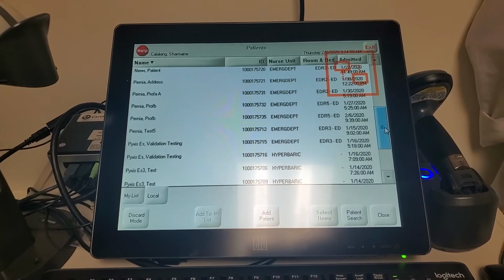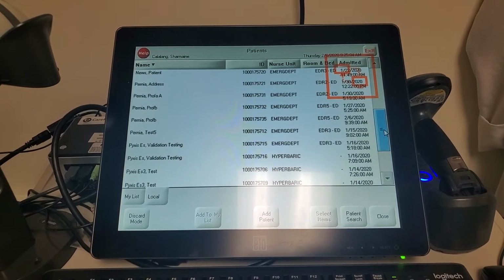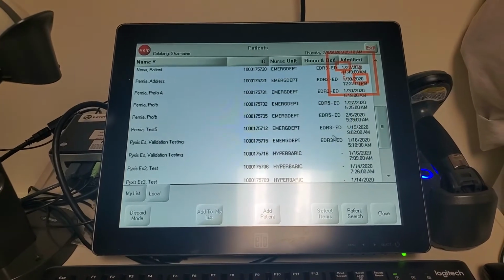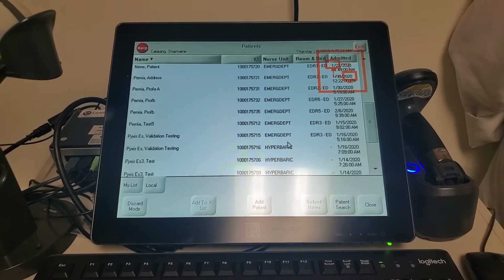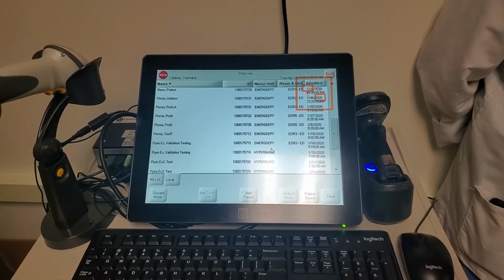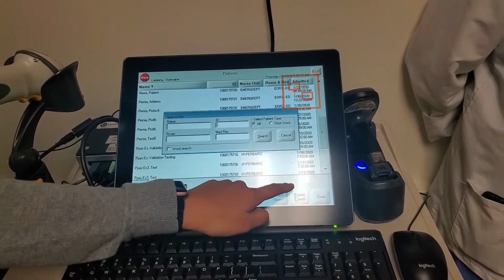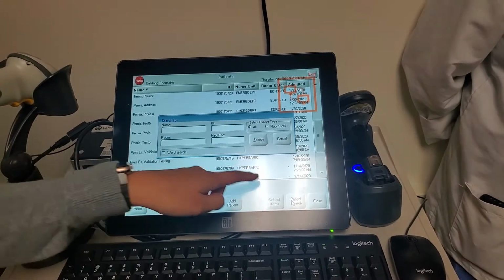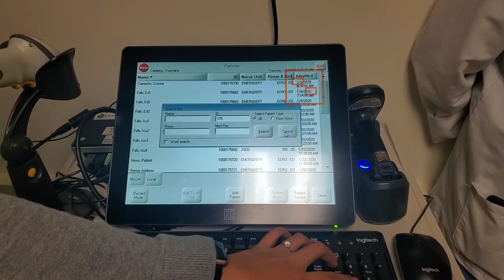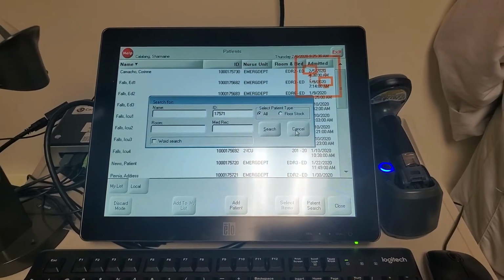Alright, thank you. For one of the users, if you can start typing, just type one of the numbers: 17571. Someone can type that on the keyboard. Yeah, 17571. That's fine.